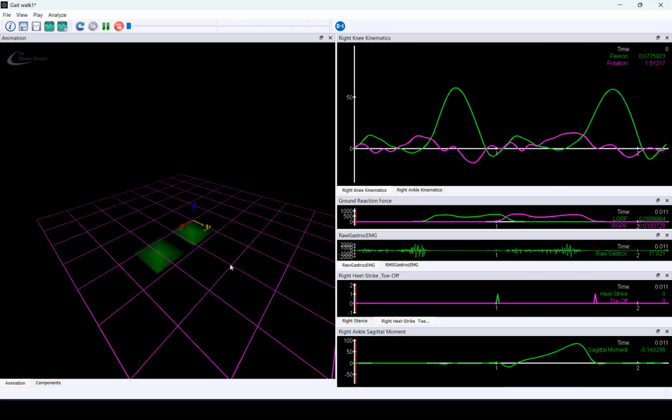We also support a range of ways to track segments, including clusters, inertial sensors, and data derived from markerless AI models. Once you've gotten past building the subject model, subsequent steps in the analysis will be the same, independent from the hardware used for collection.